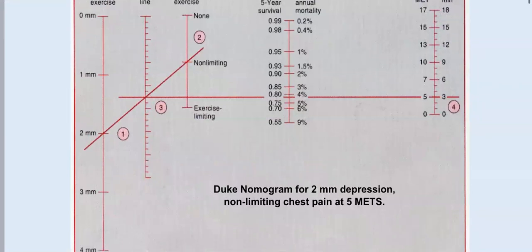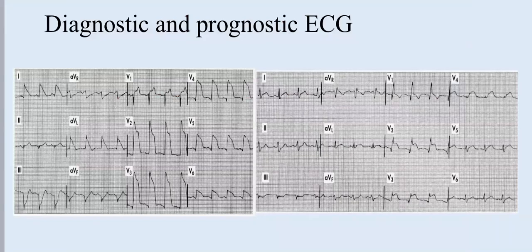Now, let's see here. We have both patients with anterior wall MI. What's the difference between the two? We have ST segment elevation on the left side and the right side. The same extent, like involvement of the leads, more or less the same. So any difference here? Any difference?